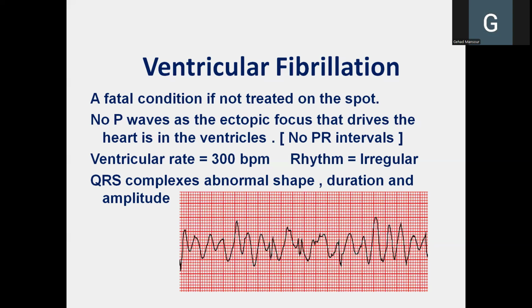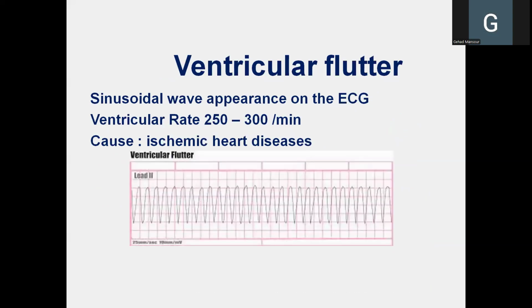We will do this in class once again, but you had better do it, for example, on ventricular flutter. Here this is a better example. Why is it a better example? First of all, because the QRS complexes are well defined. And second, because you see the marks here, 5 squares. Look, 1, 2, 3, 4, 5. So every 2 successive marks include 5 big squares.